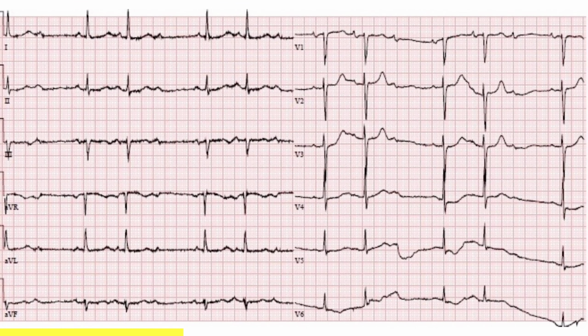Let us see this ECG. The heart rate is 60 beats per minute. Rhythm is regularly irregular. The QRS complex is upright in lead 1 and downwards in lead 3, which shows the left axis deviation. The PR interval in conducted beats is constant. Each P wave is associated with a QRS complex until there is a P wave that is not followed by a QRS complex. Also, the P waves march through at a constant rate.